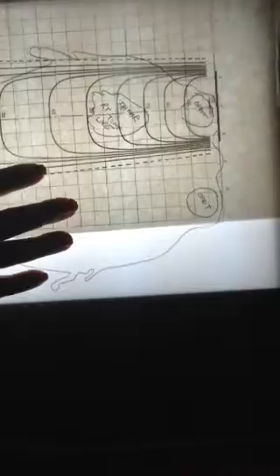And then I'm going to put my second beam on. Again, this is the central axis, so I have to make sure the central axis lines up with the central axis on the isodose chart. Put my T at the beginning of tissue, and then I'm going to trace that beam. Okay, so now the first step in this would have been to trace the AP beam on. And so after that, this is what that would look like.